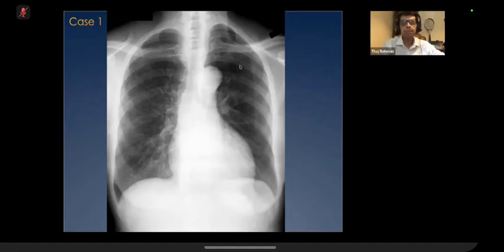All right. So I'll continue to analyze systematically. It's got bony density, isn't it? If you can trace the ribs, you can see the rib and the costochondral junction. So that's how you subtract. When you report a plain film in your reporting session, you might keep wondering, what is that? Is that significant? That's how I look at it in my practice. It continues downwards and has a bony margin. So I think that's a bony structure. I would ignore that.